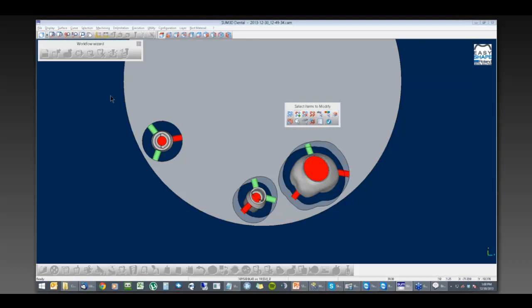And we're going to notice that there's a little box that pops up on our screen. And you're going to have the actual names of the layers listed out here. So DMH is the name of the layer that pertains to the connectors. And it's also color-coded. So we see that there's 2 different DMHs here, one for green and one for red. So when I select the green, you can see that all the green connectors on the disk are selected. When I select the DMH layer that's colored red, we can see here that all of the red connectors are selected as well. We can also unselect those just by simply checking or unchecking those boxes.